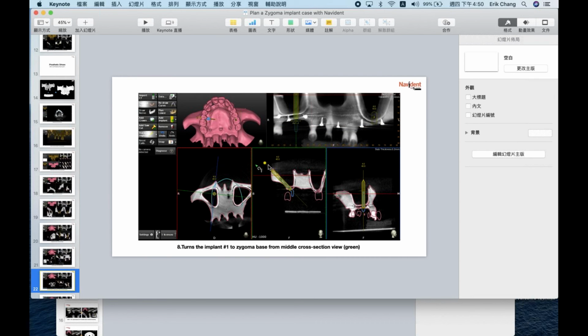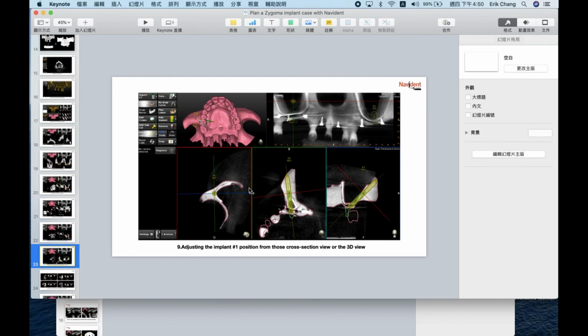Yes, Southern Implants, and they have the straight type, or the 45-degree or the 60-degree platform. So I make an example here with the 45-degree from Nobel Biocare. Before I tilt the implant to the zygoma, I will add a 45-degree abutment here.